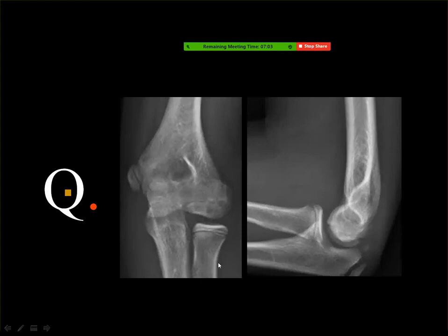Then this is an X-ray of the elbow joint of a pediatric patient. Avulsion of the olecranon fat? Bone. Is it an avulsion fracture or what? No, these are the non-united epiphyseal centers. This one belongs to the humerus, and the lesion is here. And an epiphyseal lesion? What is the name of this? Is it an epiphyseal lesion?